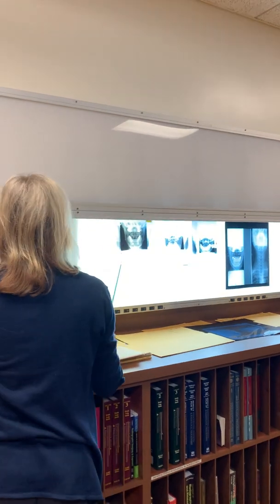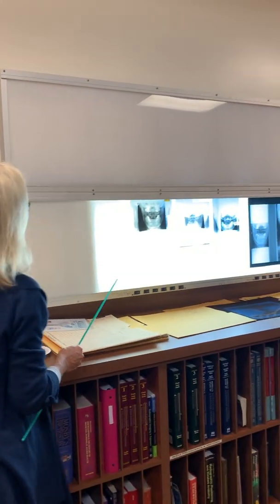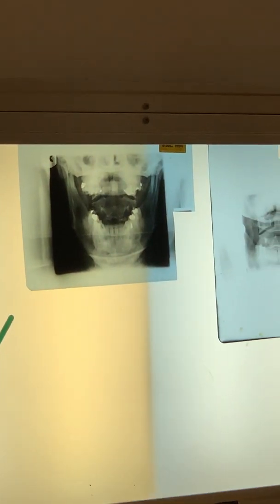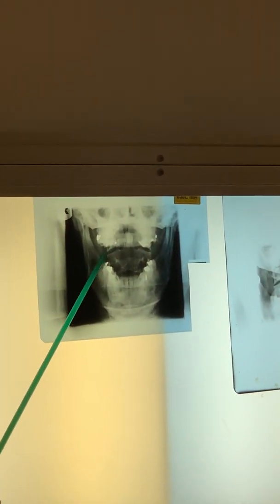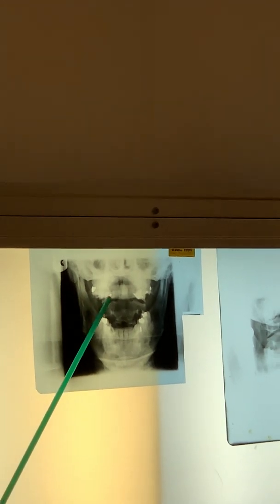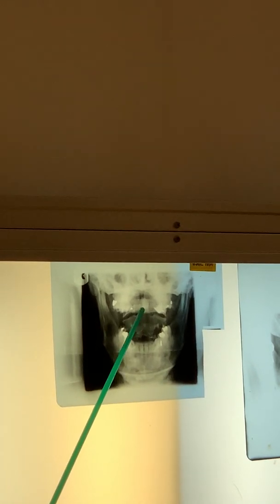Okay, let's start with this one. You kind of see the space. We don't say space. We see the apophyseal joint. See the spaces? Yeah, so we see the apophyseal joint of C1, C2. So we can see it with the AP, not the lateral on C1, C2. So we see the apophyseal joint, but what don't we see? We don't see the odontoid process.